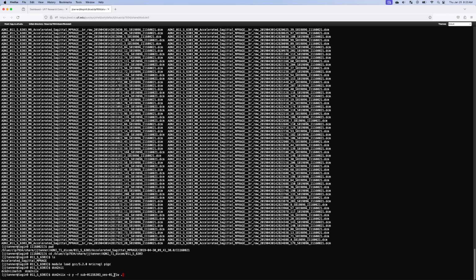Now in this case, because there's just one type of image in this directory, we can do this whole naming and name it right as a T1 file. If I was running this command on the directory and there were a lot of different types of scans, let's say there was T1 and T2, there were diffusion scans, there were functional MRI and all sorts of things, I would leave off this -f and just have it find all the different scans and just kind of automatically name them something.